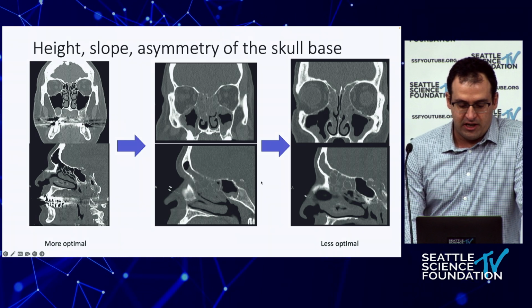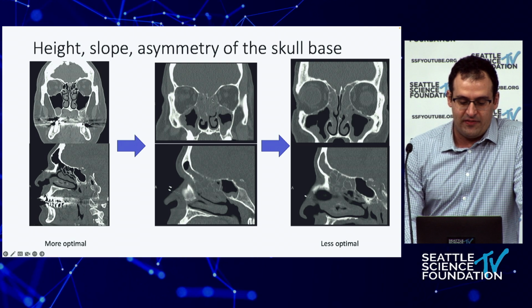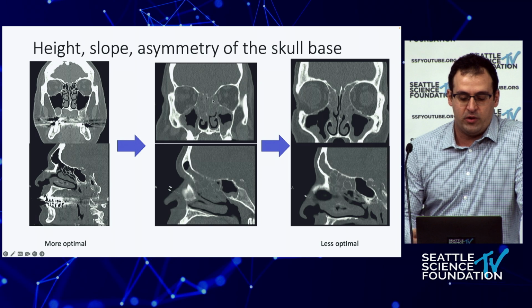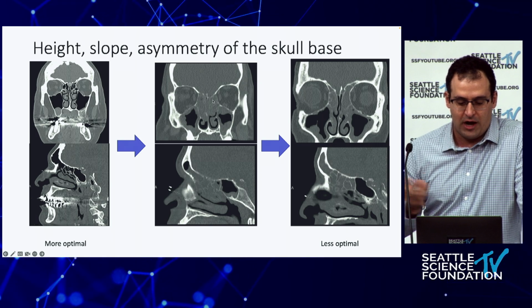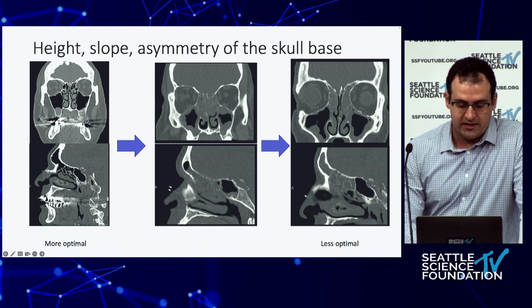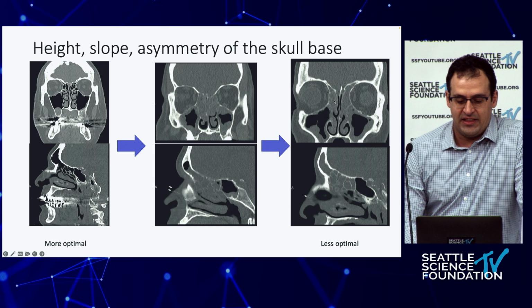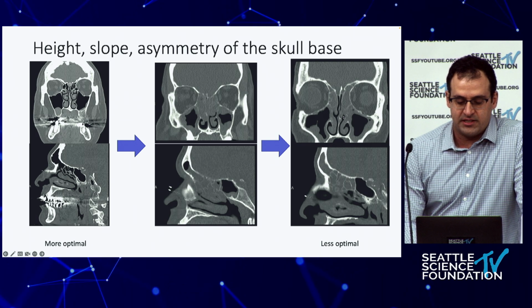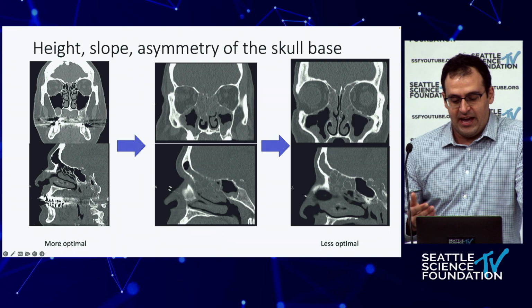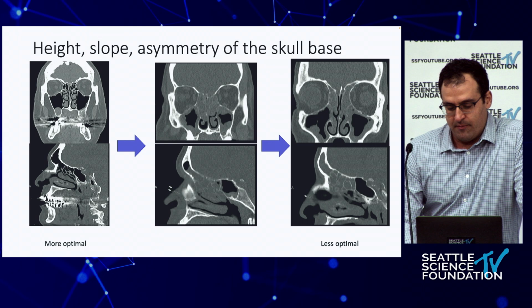As you move to the middle here, you have a more obliquely oriented skull base, and that is one of those things where you need to be prepared that when you take those cells off laterally and try to go medially, you could run into the skull base. So just be aware of that. As Nathan mentioned yesterday, that obliquely oriented skull base on the right side is where classically we believe there is more likelihood of skull base injury and CSF leak.